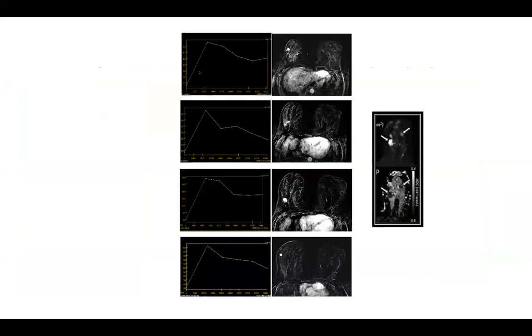with further detailed assessment by a dynamic contrast study, showing us that the focal areas of abnormal contrast enhancement also show type 3 time intensity curves with a sharp upslope of contrast uptake and acute downslope of contrast washout, and furtherly showing focal areas of preferential diffusion restriction compared to the background normal diffusion behavior of the fibroglandular breast parenchyma.